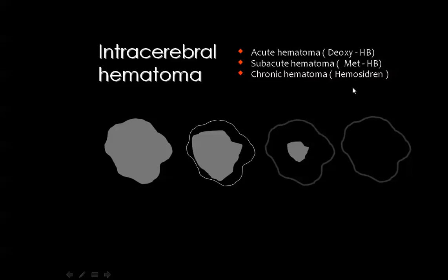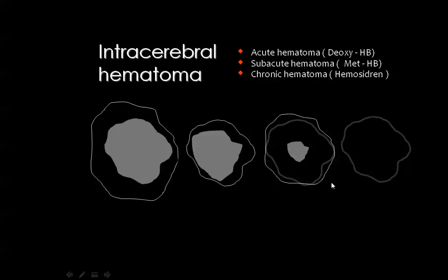And the appearance of hematoma on MRI is quite different from its appearance on the CT scan. But please remember that whenever the hematoma is formed and you have seen the hematoma on MRI, it will change rapidly from the acute phase to the subacute phase to the chronic phase. And the change is usually from the periphery towards the center. Then, each hematoma is surrounded by some degree of perifocal brain edema, and the edema is usually little in the old stages of the hematoma itself.